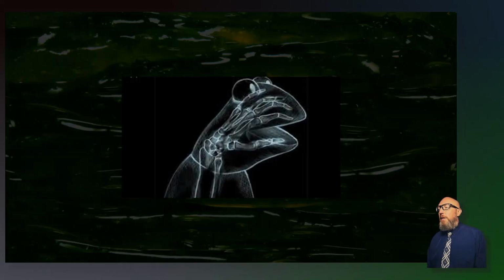And so to close, here's an actual radiograph of Kermit the Frog. Look at his sinuses, they look surprisingly like hand bones. So that's interesting. So that completes the paranasal sinus diseases.